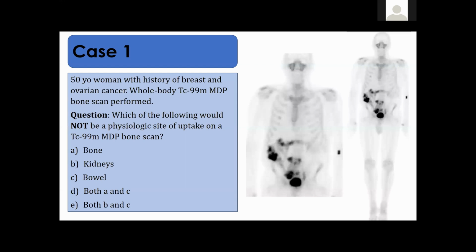This patient has ovarian and breast cancer, and for the ovarian cancer, the patient took pelvic radiation, which causes colovesical fistula. So there is a fistula here between the urinary system and the bowel, which causes us to see contrast within the bowel, as in this patient.